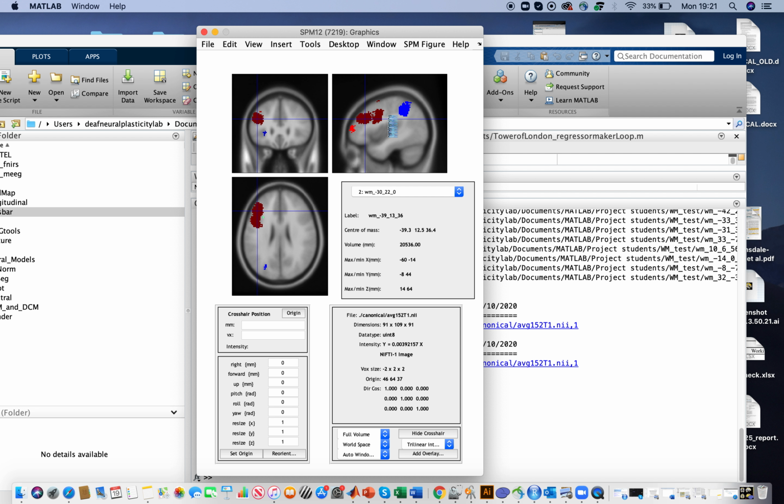You can also work on a big cluster, like for example this dorsolateral prefrontal cluster that you see here, that is very big. Using the center, you will build a sphere at the center of this cluster. You can use it in a pretty convenient way.